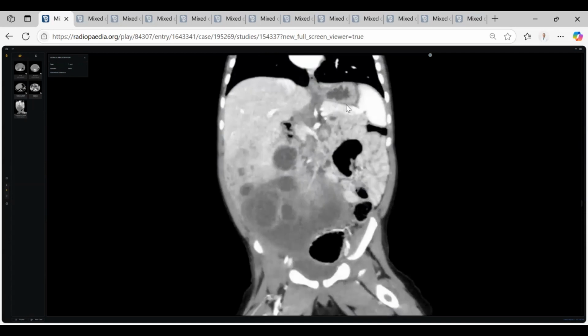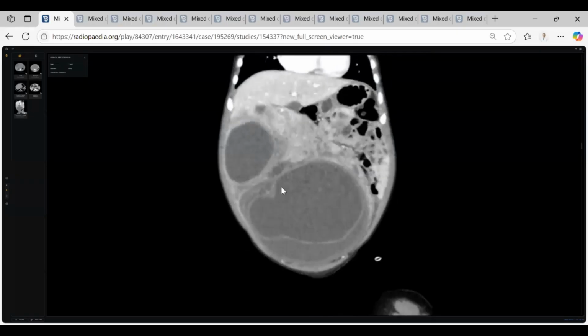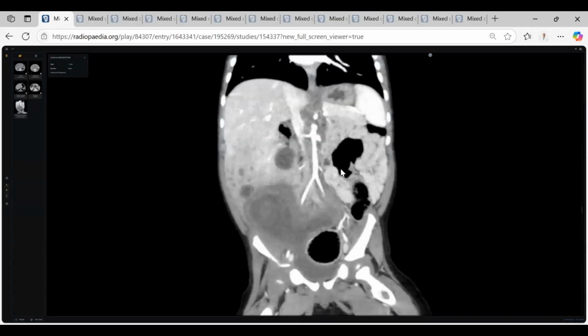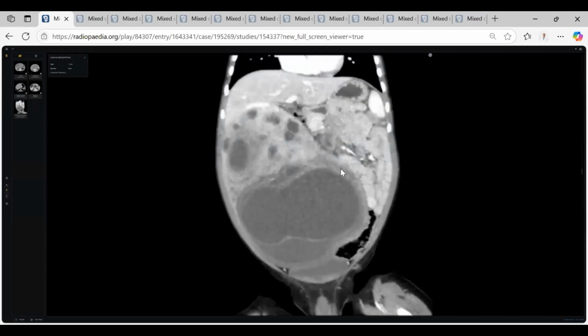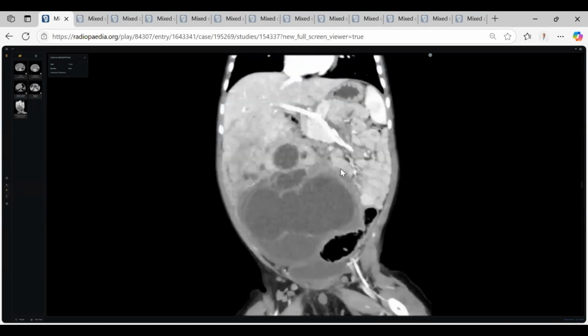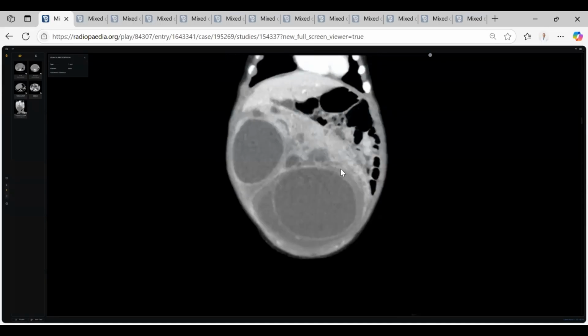Okay. Yes. So do you expect this? Hemangioendothelioma. Okay, but hemangioendothelioma will show gradual filling towards the center, and in the arterial phase peripheral nodular enhancement. So we exclude two possibilities. Last possibility, did you hear about a congenital hepatic mesenchymal hamartoma? This is a congenital hepatic mesenchymal hamartoma. And how to differentiate? It is mainly cystic. More than 80% of it is cystic.